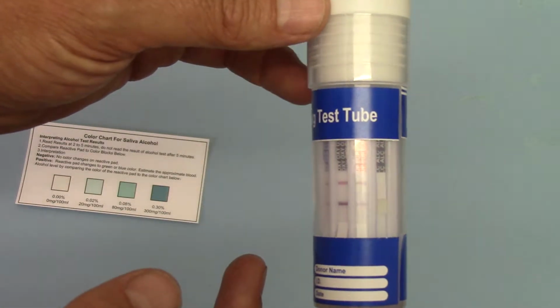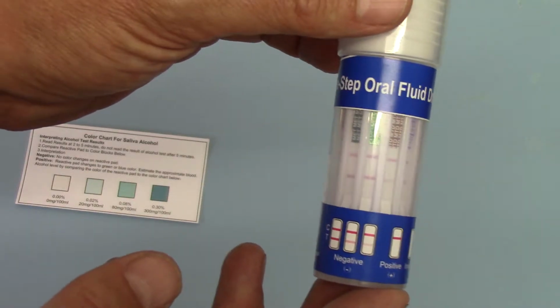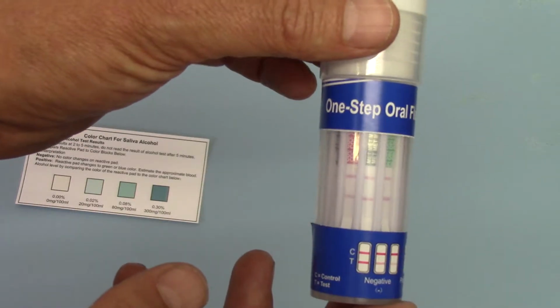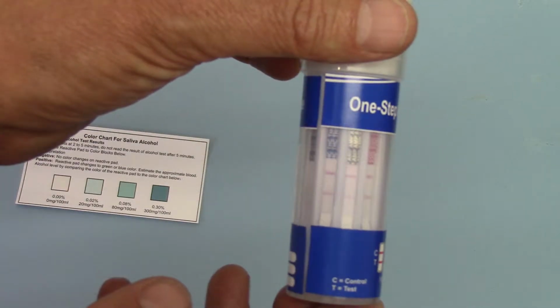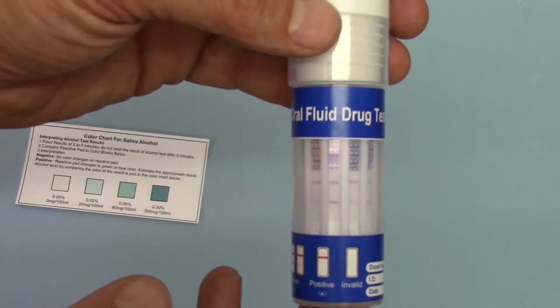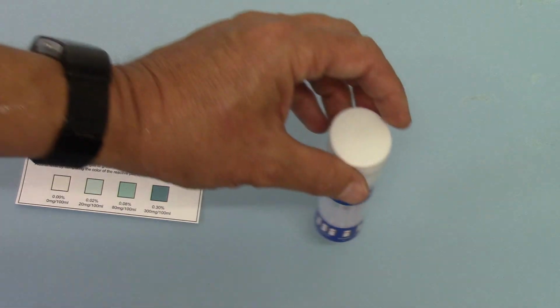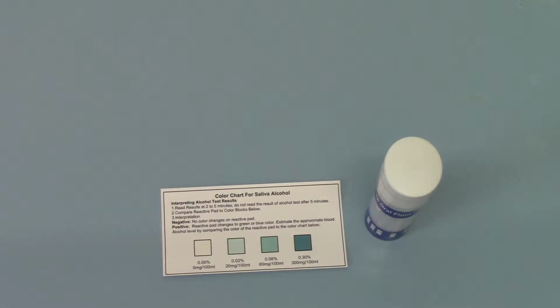You must, however, in a presence of a control line but no test line, give it the full 10 minutes developing time before you interpret a positive indicator for this point of care test. So that is important. You can interpret your negative results very quickly with this technology, but you must give it the full 10-minute developing time before you interpret a positive indicator.